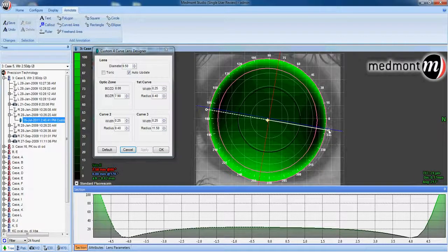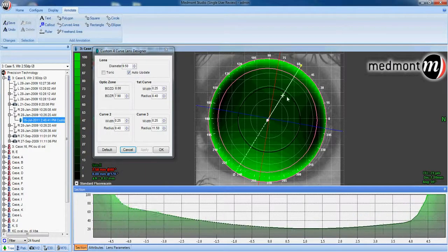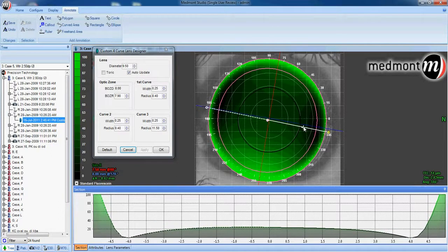Next, take this white axis line and find the point on the graph where the lens seems to land on opposing sides. And it appears that on our with the rule corneal astigmat, this lens lands very close to 9 o'clock, and again on its opposing side at 3 o'clock. So we have apical clearance of approximately 24 microns down to touch at 9 o'clock.